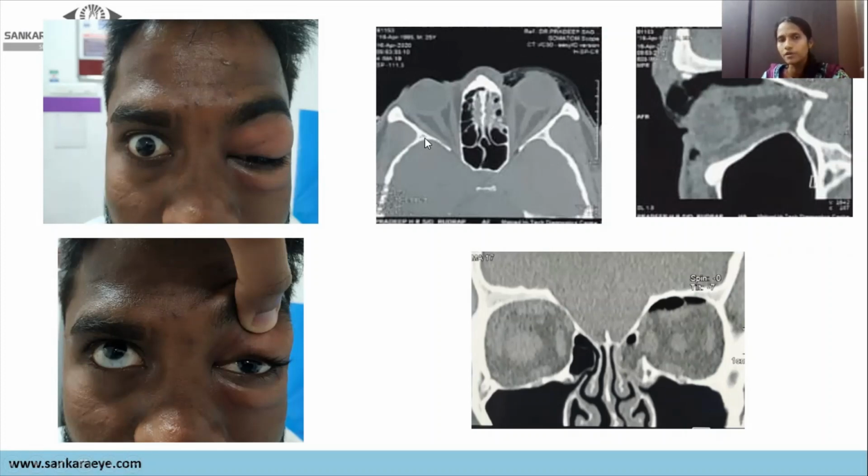You're seeing the details of bone, and it's a non-contrast because sclera is not enhanced, and showing a hypodensity in the adnexial region of the left, in the left adnexa, along with discontinuity in the medial wall of the left orbit, and you're seeing the normal muscle content. And also, when you see here in the posterior coronal, again you're seeing the discontinuity and the normal contour of the muscle. So this is a case of medial wall fracture without muscle entrapment with orbital emphysema.